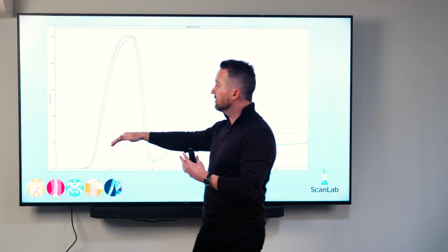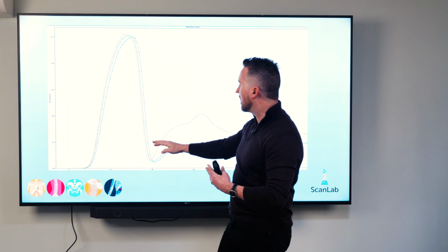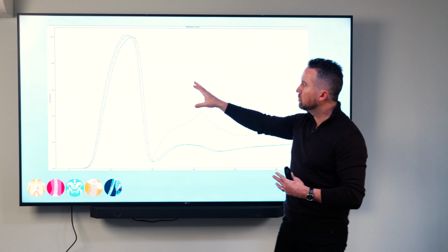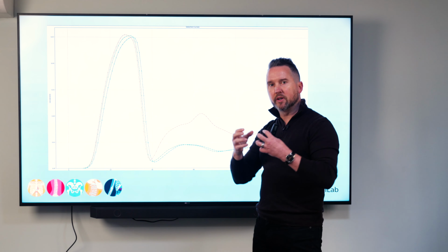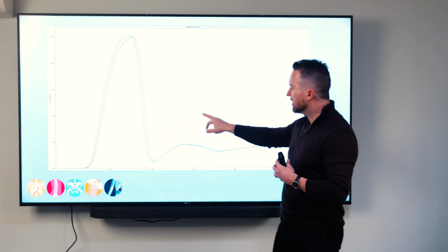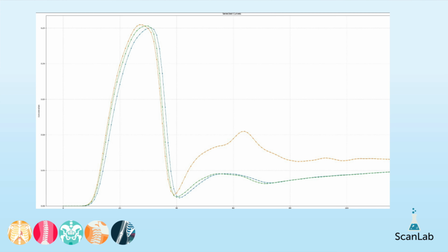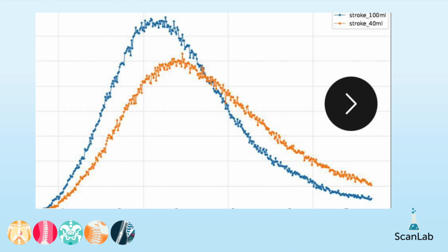As contrast washes into the bloodstream, it becomes brighter, or it has a different concentration due to blood. So we're able to mimic the curves correctly, but you see here, this is a patient with 3 different stroke volumes, 3 different amounts of blood that enter the system for every beat. And that's obviously a mistake here. There's no reason why the second pass of contrast would be so much greater for one than the other. So we had to continue to recalibrate all of our methodologies and all of our sims. Then we were able to do that basically.